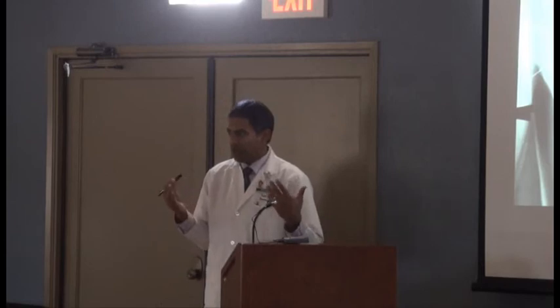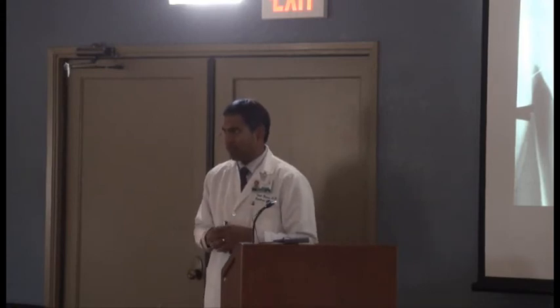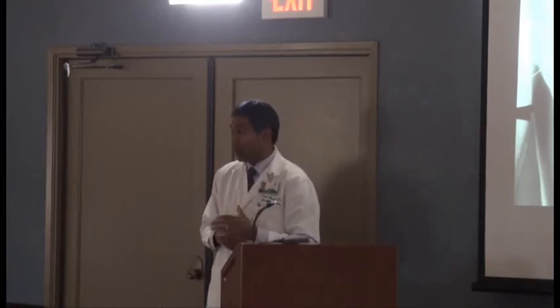What do you think is going on in your mind here? Rose, what's happening with the patient? And why is the patient becoming hypoxic? And what are the chest x-ray findings? The heart, the hint is the heart. It's bigger than it should be. The heart is bigger, yeah.